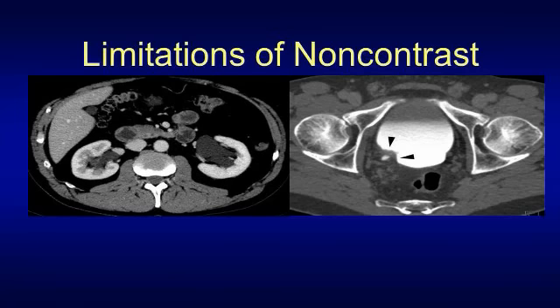The patient was imaged with IV contrast not because of this, but because there was actually also a mass within the mesentery, and we wanted to characterize it further. And after we gave IV contrast, you can see differential enhancement of the right and left kidneys. The right kidney is delayed. Again, there's no hydronephrosis, but when we image the bladder, we can see that there's a mass at the right ureterovesical junction. In this case, this was a hematoma due to a recently passed stone, but really a great example underscoring the importance of IV contrast in identifying even mild cases of obstruction.